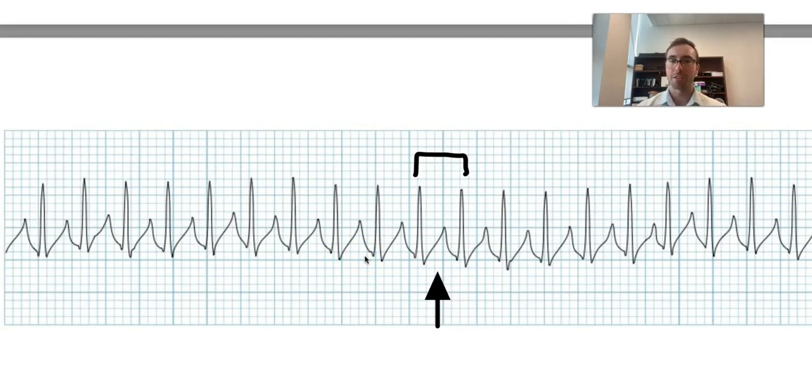Some sinus tachycardias can manifest over 150 beats per minute, but the key way to distinguish that is that there would be a P wave and a T wave that is undeniably seen on the ECG pattern. So this is a supraventricular tachycardia because, again, no identifiable P wave. Can't tell if that's a T wave or vice versa, and it's quick. So that's a pathological rhythm.